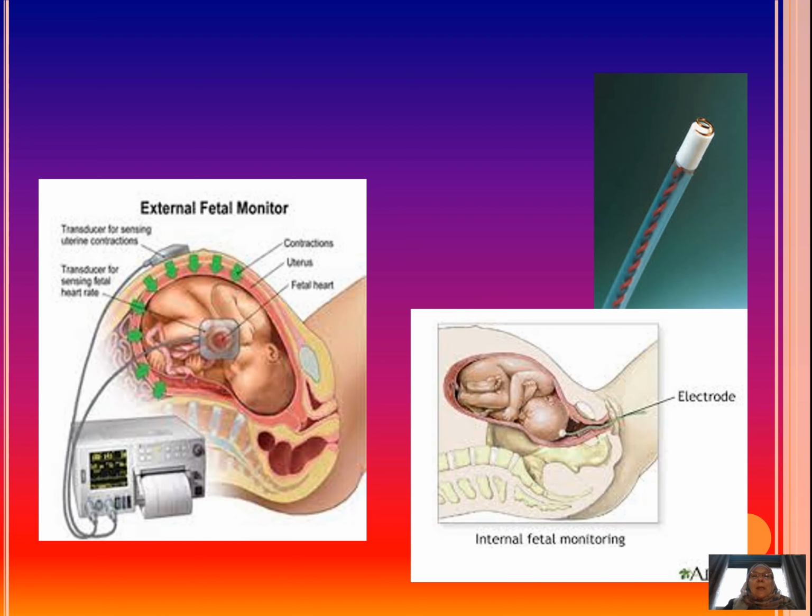During labor, it might be that the mother moves a lot, so that the heartbeat is lost quite a lot of the time. But as a doctor, you want a continuous CTG monitoring. Then it is possible to use a fetal scalp electrode, which you see in the two pictures on the right.